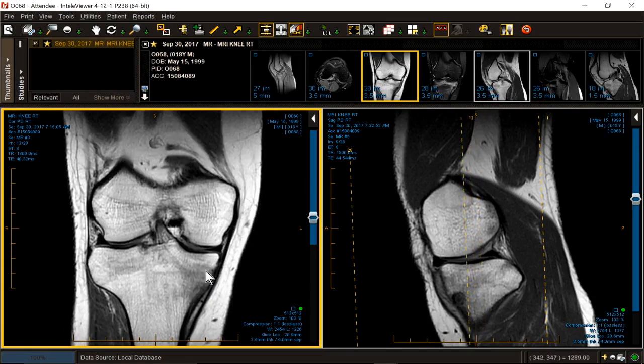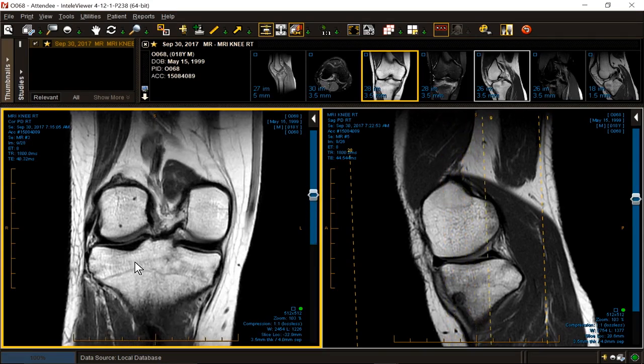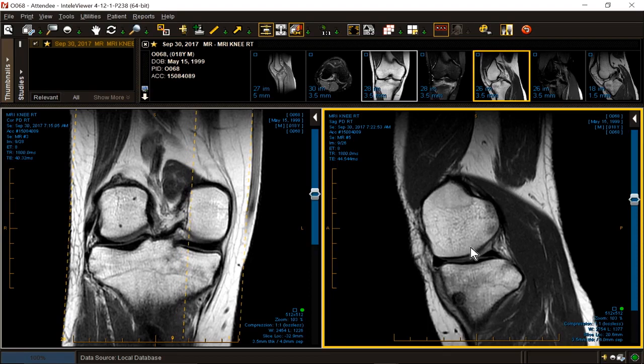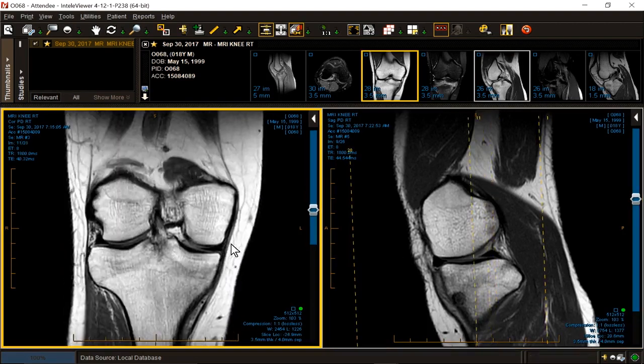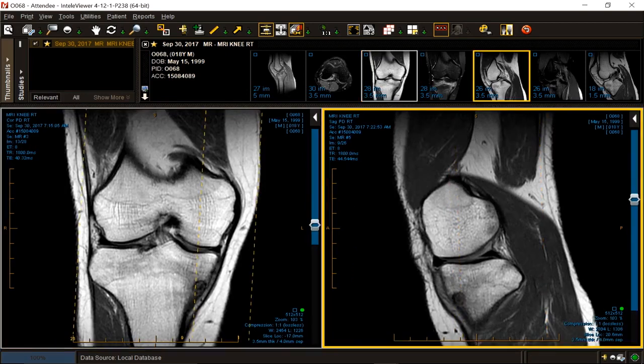So your first instinct is to call this intramedullary cancellous bone microtrabecular injury that's persistent, and you might be right. Perhaps the patient is changing his gait, altered mechanics of weight bearing because he's got something else going on, and he does. He's got a lesion in the tibia. Let's keep looking, shall we?